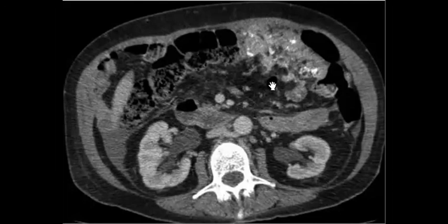Okay. What is this? I would not be very happy if you didn't mention what it is. Okay. Because we have very nice cases before. Yeah, what is it? Okay. So I will show you other images now.